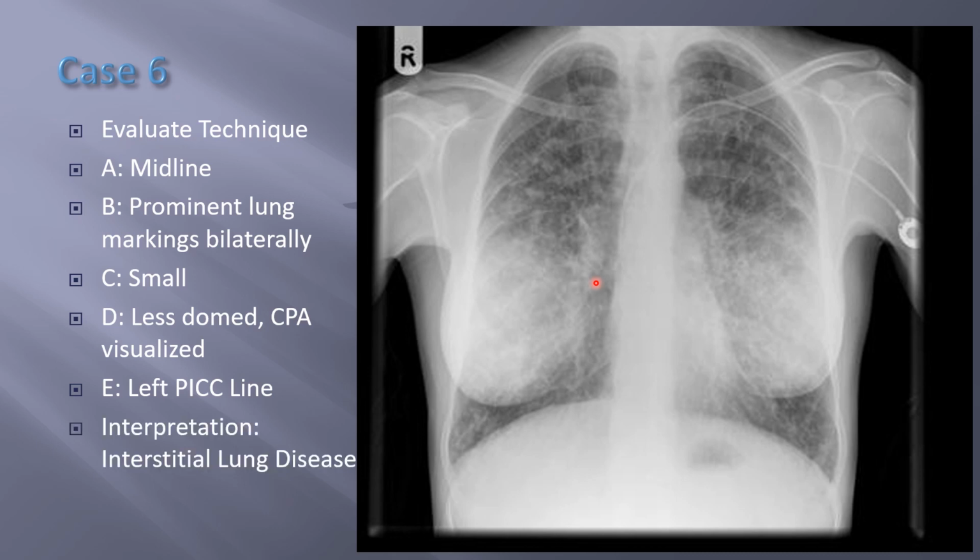So my interpretation here is that this patient has interstitial lung disease. So it has some sort of lung disease that's causing this thickening of the lung tissues throughout. It's not edema, it's more like scar tissue or thickening of tissue. And that could be related to chemotherapy. Some chemotherapies can cause interstitial lung disease in patients and cause a restrictive lung problem, where the lungs become very stiff and it becomes hard for them to oxygenate and sometimes even ventilate, control their CO2s. So that's interstitial lung disease.